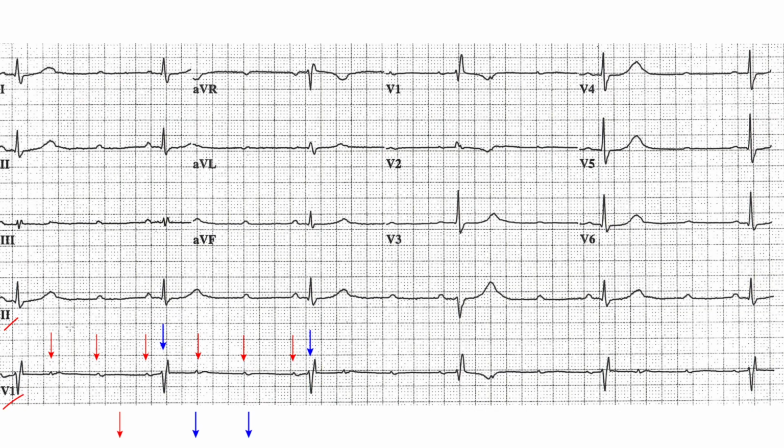I'm really going to drive this point home. So this right here is atrial, right? I'm just going to draw a line. And this is something you should do when you're out in the field or in the hospital or whatever the case is. Take a straight edge, any straight edge, as long as you're sure it's straight.